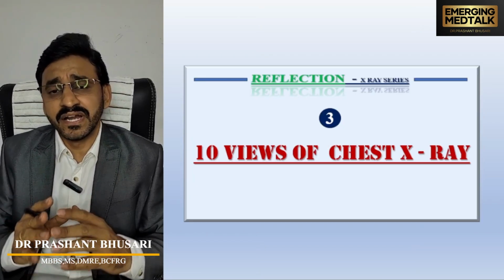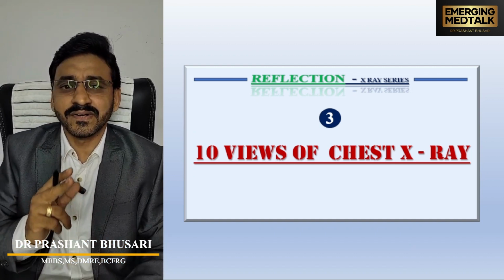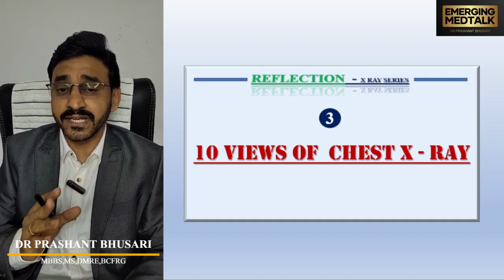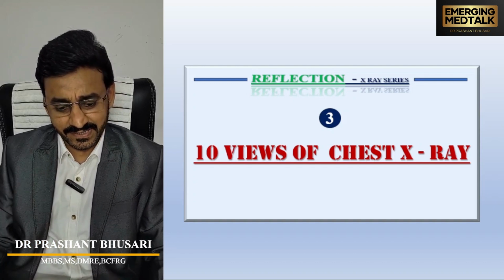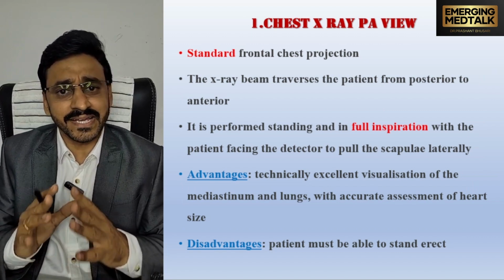Discussion is on 10 views of the chest X-ray. Very most common is the posterior anterior view. Routinely we are doing that in 90 to 95%, then the anterior posterior, then lateral and other views. So the first view is the posterior anterior view.